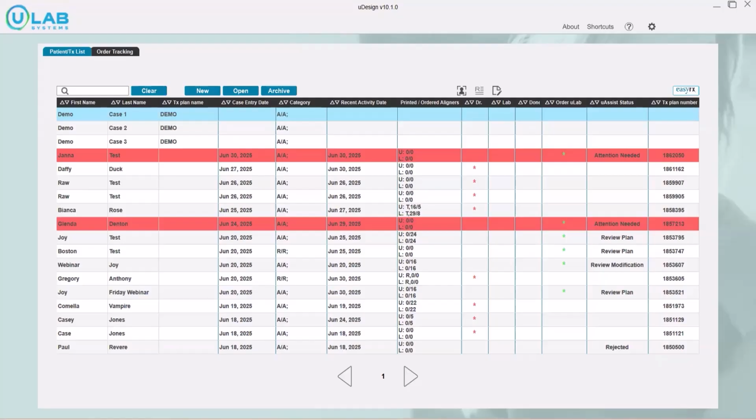In this video, we will review how to submit refinement scans on an existing patient on a self-planned case. We recommend that you have your new scans exported out of your scanning software and saved onto your computer.